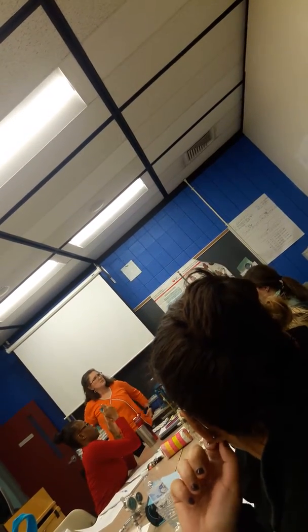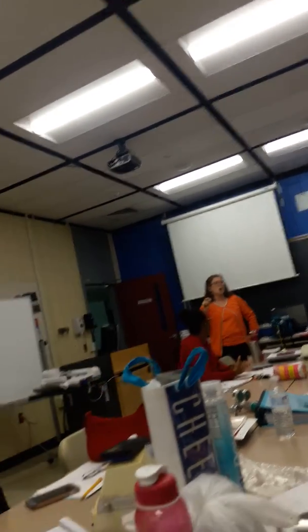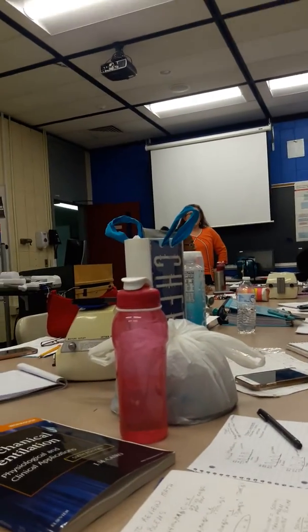I have a question about this. When you're doing compliance, should it always be in liters and not milliliters? We go back and forth. But if I'm trying to figure out the time constant, time constant always has to be done in liters. So it would have to be with the decimal point.